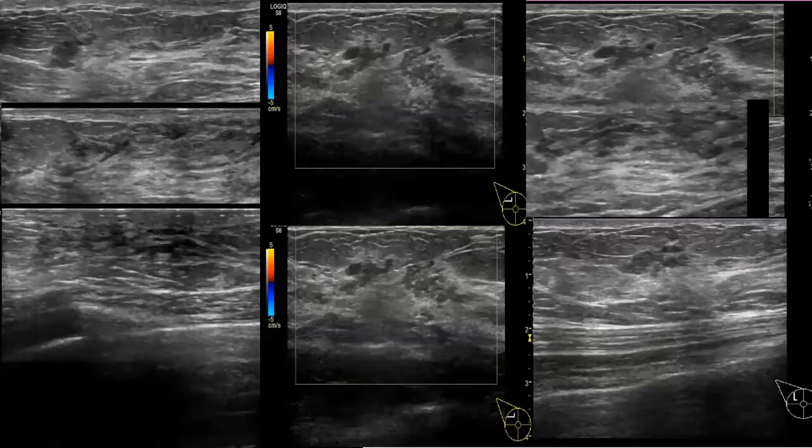So this is ultrasound. The ultrasound shows microcysts, I think, associated with the area of architectural distortion. Where is the cyst? You mean here, this is ductectasia, okay? Ductectasia, but I mean in the upper, this is soft tissue. Different angle for the same area.